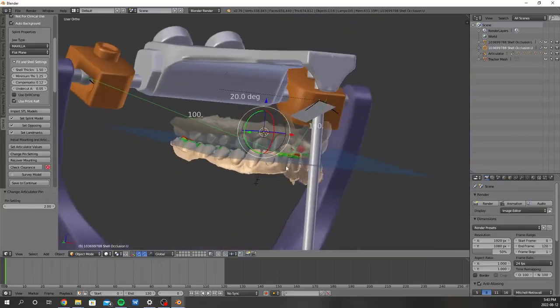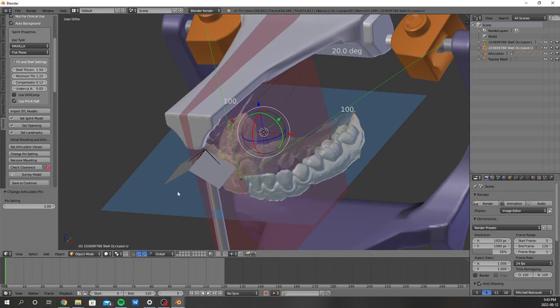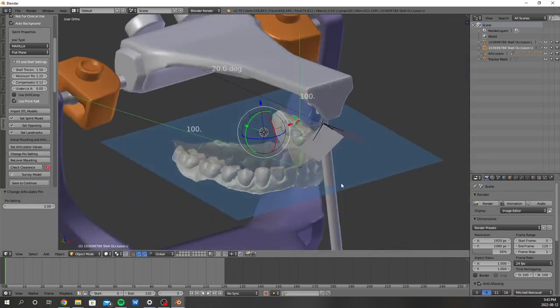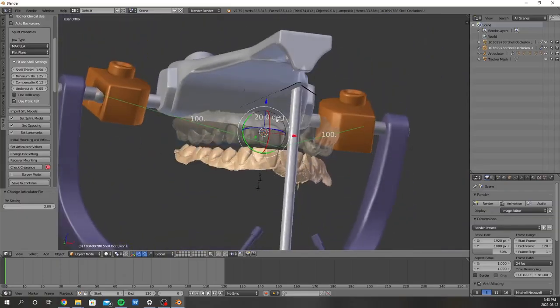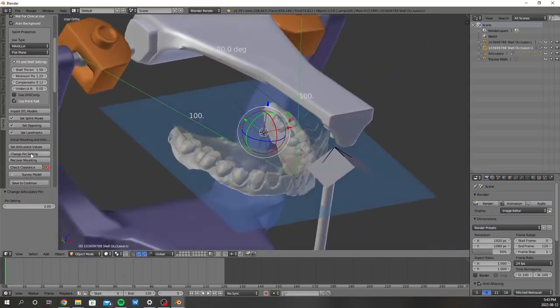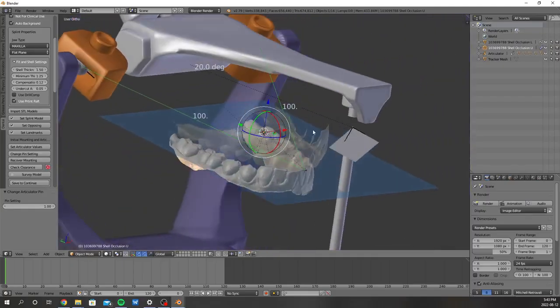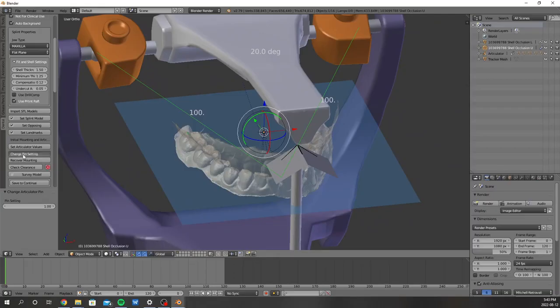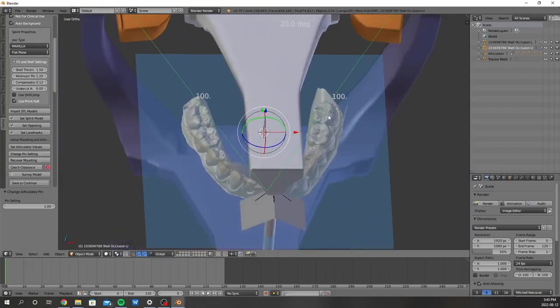We still see that we got some stuff going on, right? It kind of saves your last response, so I just hit 2 again. We're really close, almost there. You don't want to go overboard because you don't want to have a massively thick splint. So I'm not going to do 2 again because I probably don't need it. We'll hit 1 again, just see what we got. Still a little bit at the back. Sometimes that's okay, but I'm going to hit it 1 more time just to show you something. So that's okay. That's probably perfect.